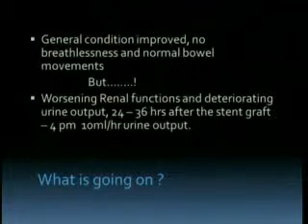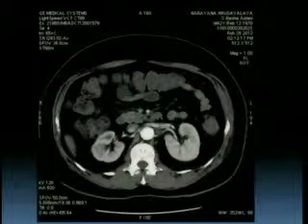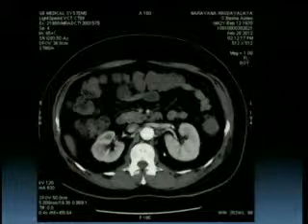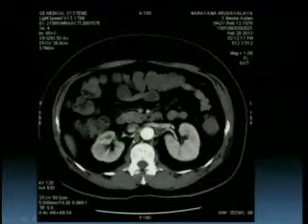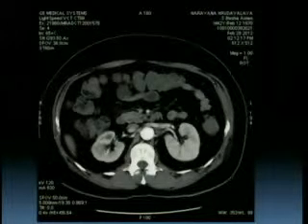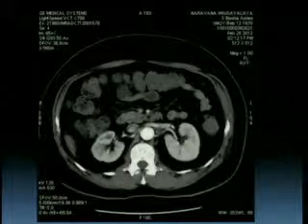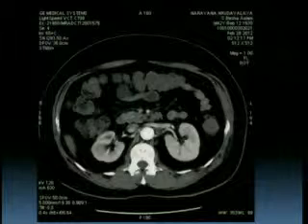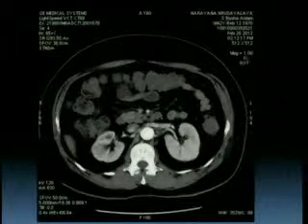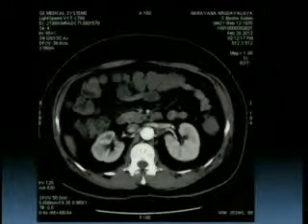So what do you think is going on? Here the anatomy becomes important, and that's why I concentrated on it. If you see the right kidney, it's contracted. The left kidney is completely supplied by the false lumen. And the true lumen is only supplying the right kidney, which is non-functional. So I understand, by looking at the CT, that this patient has now stopped the circulation into the left kidney, and I need to fenestrate. So this is important: a deduction from the CT that this patient now needs a different treatment, and that is to create a connection between the true lumen and the false lumen.